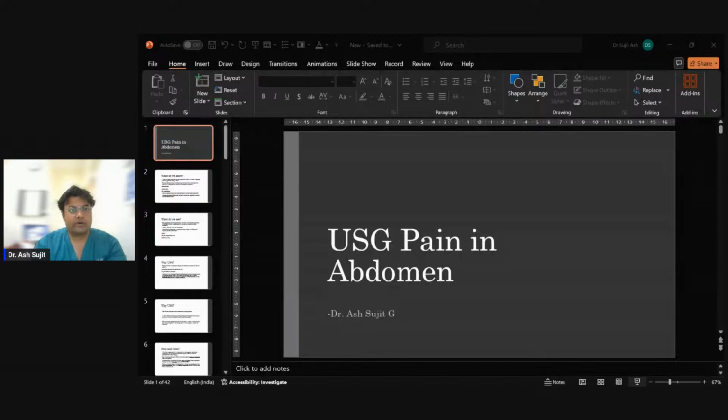We know what endometriosis is. It's ectopic endometrial tissue, which can result in endometriomas. Unlike a hemorrhagic cyst, endometriomas can demonstrate a range of sonographic appearances, depending upon the blood product degradation. That is what we've initially spoken about in hemorrhagic cyst. Therefore, at initial stages, it might be a little difficult to consider this and differentiate it.